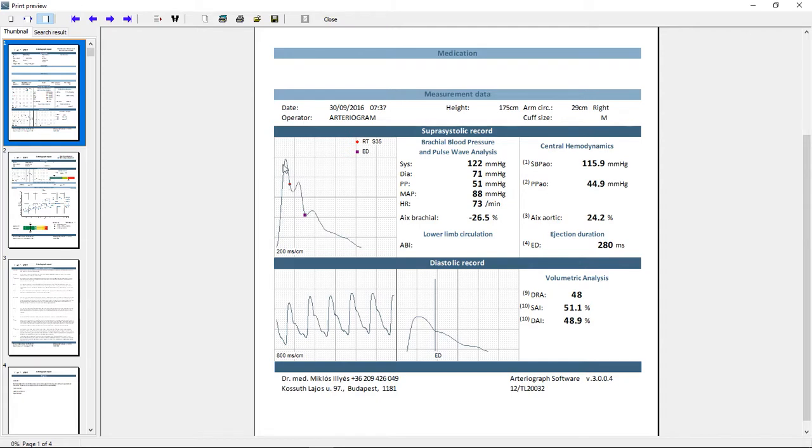The standard and normal pulse pressure curves can be divided into two parts by a valley in the curve, which is called the dicrotic notch. This is created by the closing of the aortic valve, dividing and splitting the pulse pressure to systole and diastole.